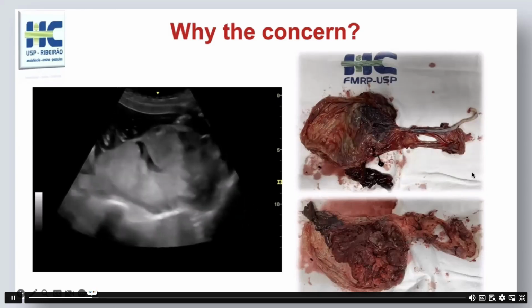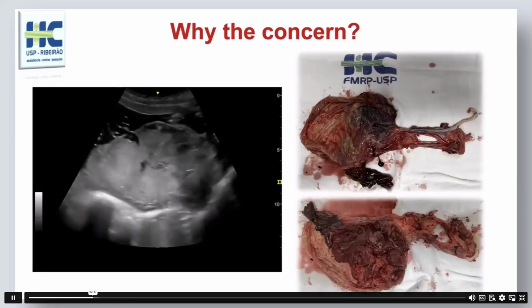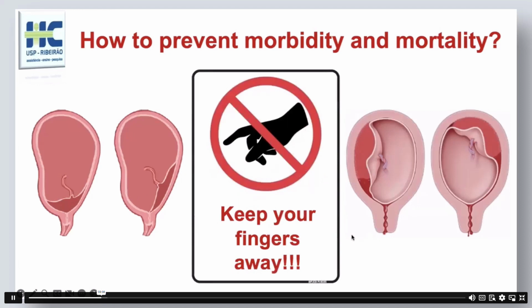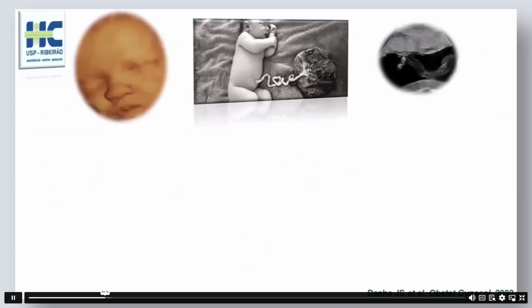So 3 conditions in just one patient, and this shows why it is important to have an ultrasound machine in the maternity suite to make this kind of differential diagnosis. And not only for this patient, but for every patient, because if a patient arrives at the maternity bleeding, we must know if the placenta is low-lying or previa before doing a vaginal digital examination. Otherwise, we can make the abruptio happen if we don't know this information before doing this kind of examination.